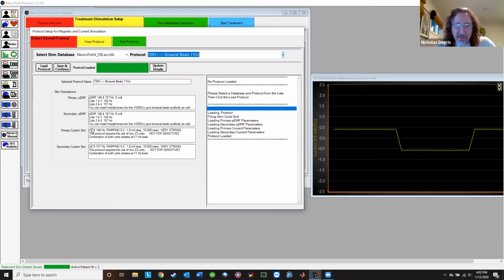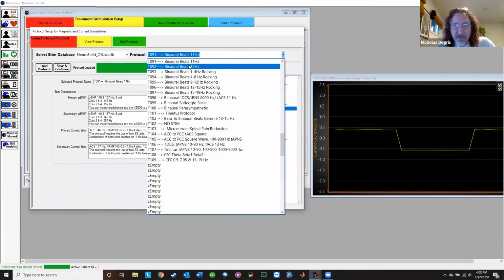So you're going to be giving these cortex frequencies that Nogier said were really good for the brain, and then also generate an 11 hertz beat, essentially. You'll see that there is 11, 12, and then you'll see frequency ranges, delta, theta, alpha, beta 1, beta 2. And then we get a triad binaural that does DC, random noise, and 11 hertz triad.